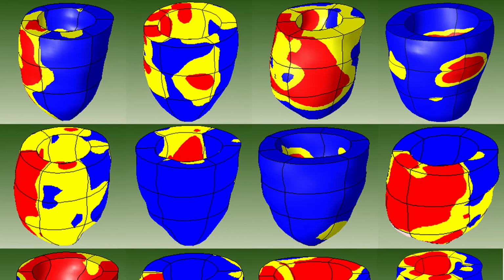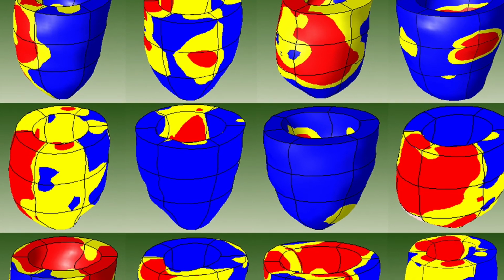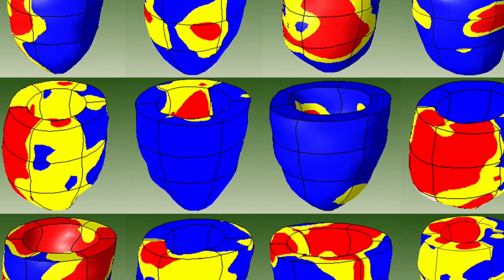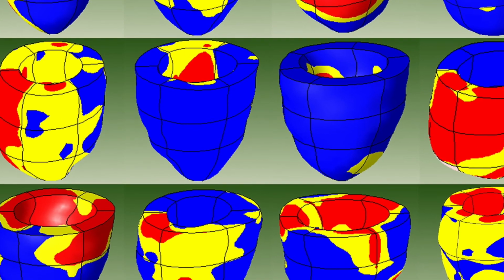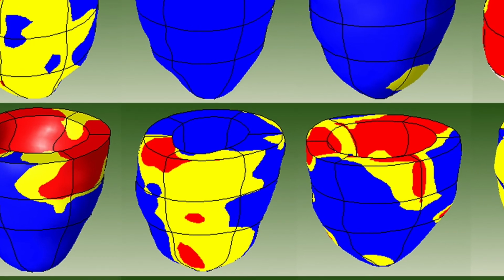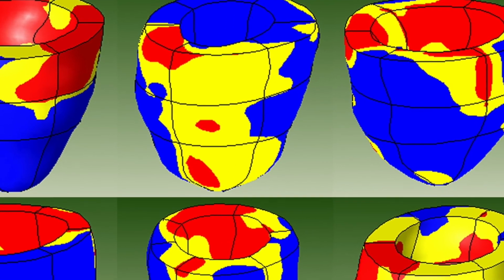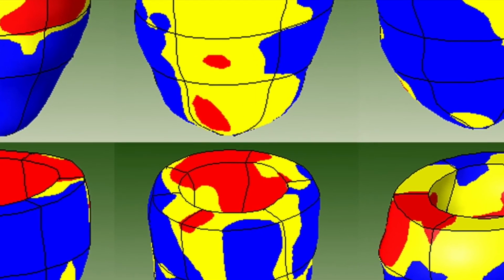The final example of clinical applications of CardioWise analysis is in the screening of high-risk patients. The results of the latest research at Washington University in St. Louis are shown in this example. Other imaging methods, such as ultrasound, measure global contractile function, and in early stages of disease, global function would appear normal. CardioWise analysis would be able not only to detect and define these early damaged regions, but also monitor them closely for early onset of irreversible contractile injury.